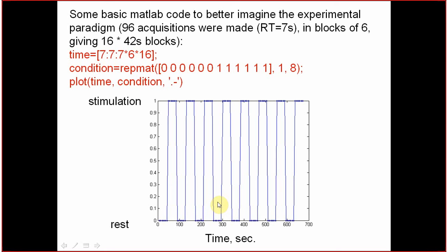This is how you can make a plot in MATLAB to see in a graphical way the sequence of those blocks timed over seconds.